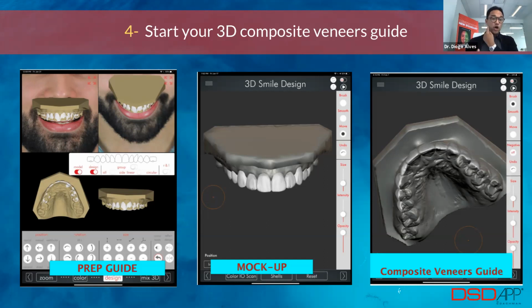You would analyze the non-working cusps to make sure that those were in an ideal position. Then you would set that new smile curve based on the curve that you're creating in the app, and you would place those 3D teeth over that smile curve. And that would create the new smile curve, the new curvature, the new buccal corridor of your design.